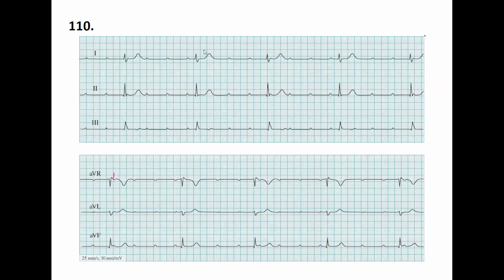Good. Okay. Yeah, and I counted the mean electrical axis by the equiphasic approach. So I looked at lead one because that looks the most equiphasic. And so perpendicular to that would be the AVF. And so since the AVF is pointing upwards, it's positive, it would be plus 90 degrees, and that is normal. Yes. However, lead number 2 and lead number 3 are not equal. Lead number 2 is bigger, so it means that you shifted a little bit toward lead number 2, so it has to be around 80.